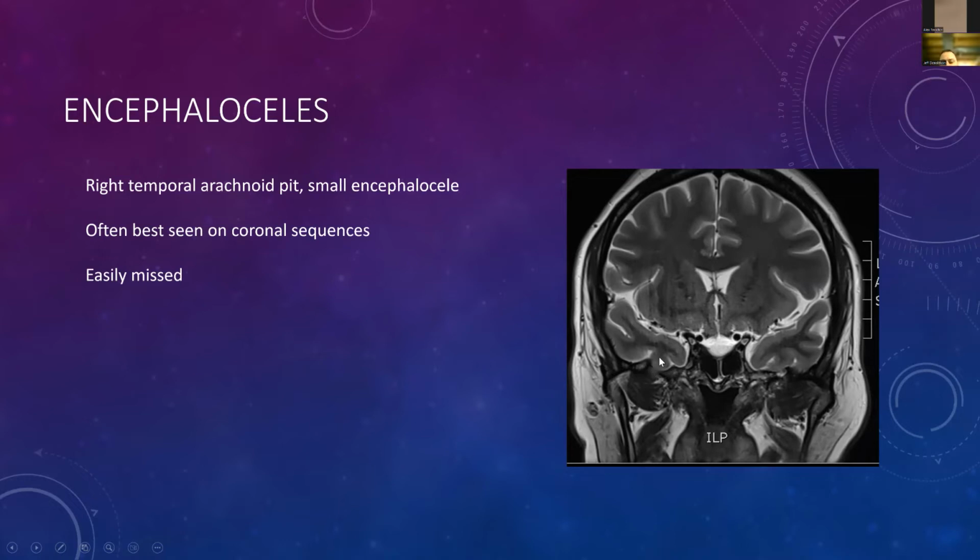These are temporal pits, in which a portion of the cortex is herniated into an enlarged arachnoid granulation, and this can be an etiology for seizures. This finding in itself is something we would comment on, but especially in a study evaluating for epilepsy, it's one that would be important to include.